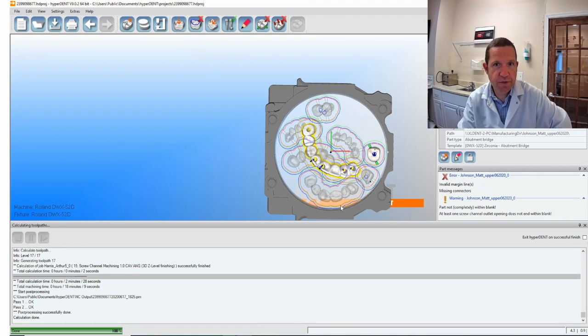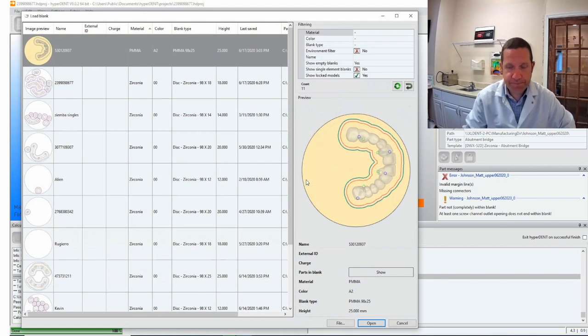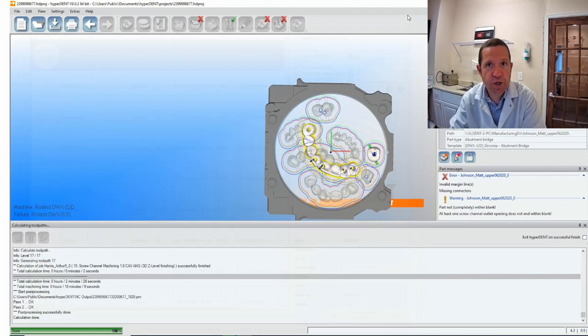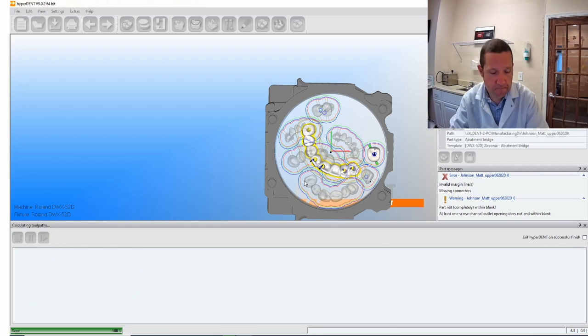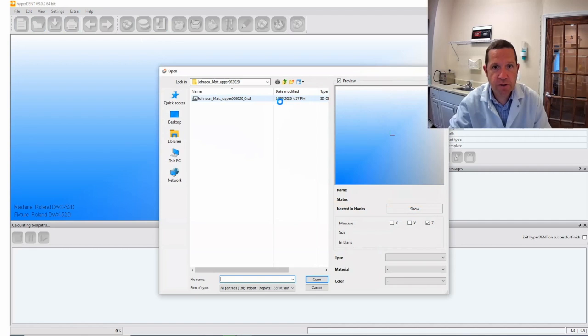I don't need it to be on this specific disk that I used previously. So what I'm gonna do is open project, go to some previous projects that I had, and see if I have a disk, which I don't have a disk already. So after what I'm gonna do, I'm gonna use a new disk. So I'm gonna click on new project. I'm gonna load the part into that new project.